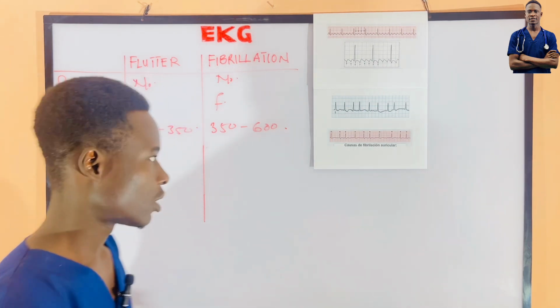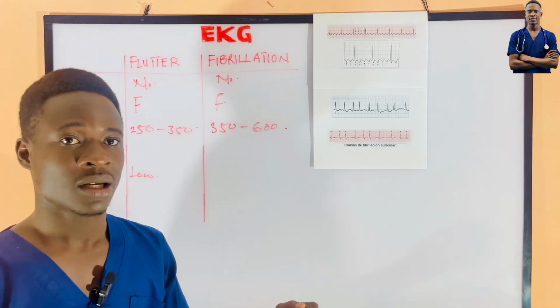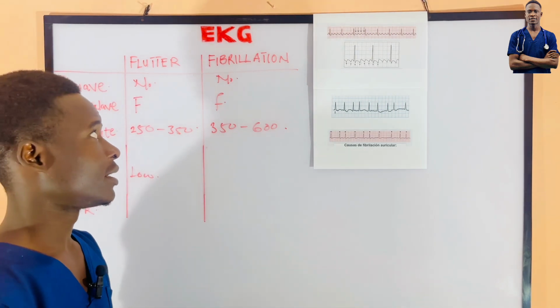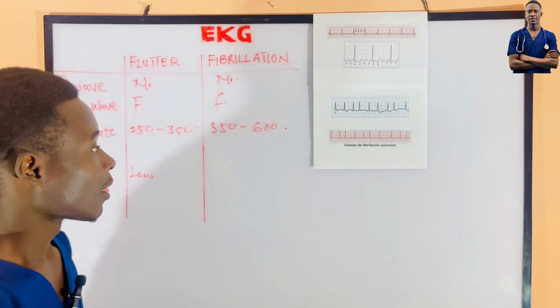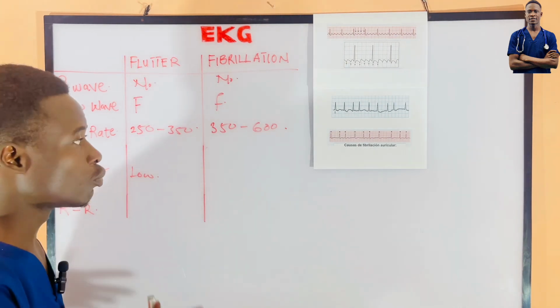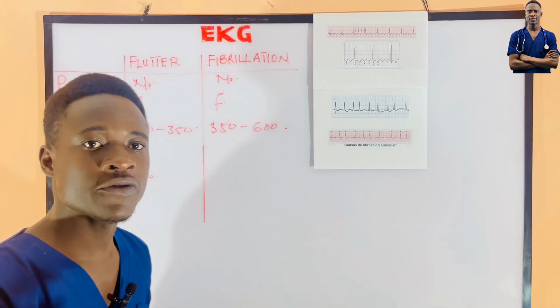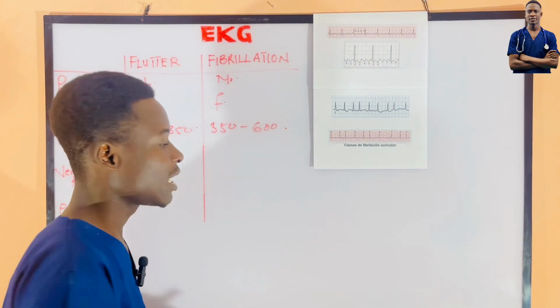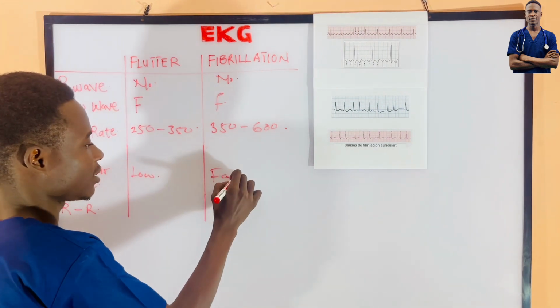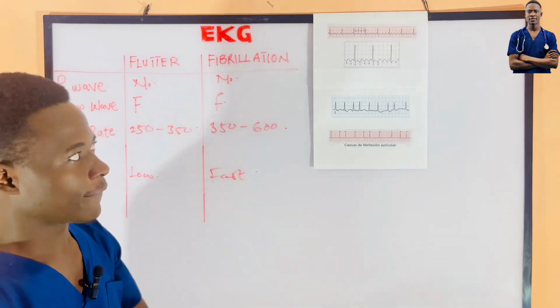Do you understand? We see the ventricles contracting slowly. Now, let's look at the atrial fibrillation. For the atrial fibrillation, most of the action potentials enter the ventricle. And because of that, the ventricle does contract at a faster rate. You see, this one is fast.